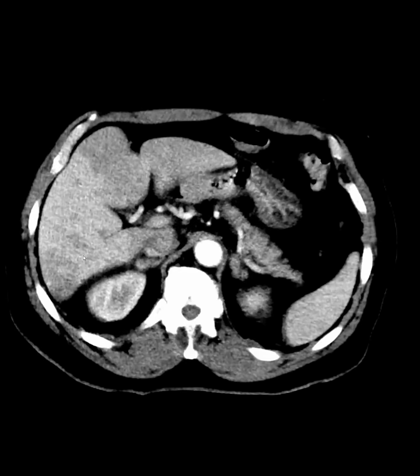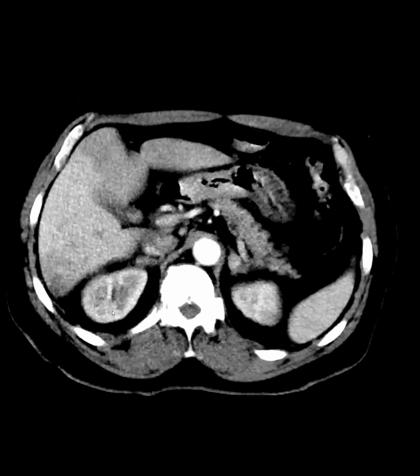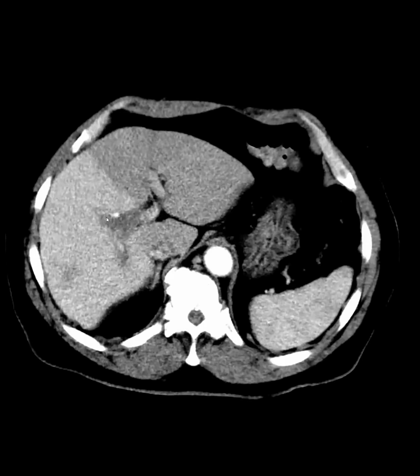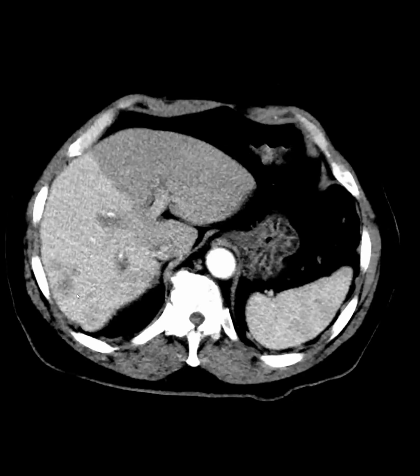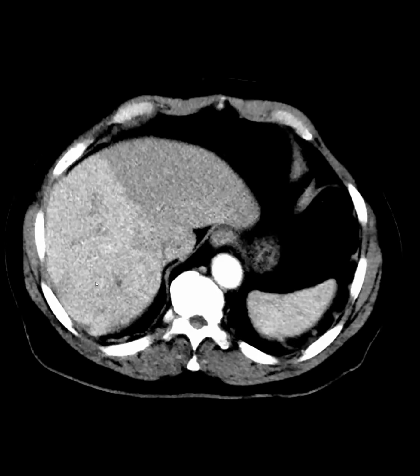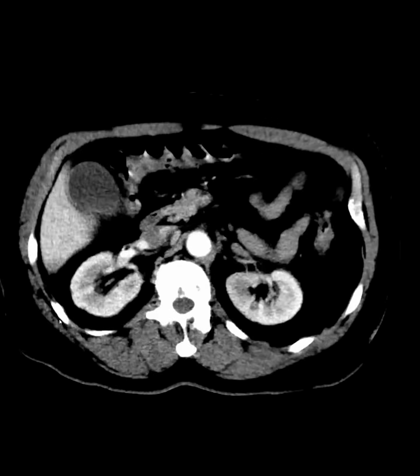Any differential for this stuff in the liver? Well, you get the perfusional change that you've shown us before. Right. Do you have the corona by any chance? We've got a portal vein thrombus, and we've got a geographic perfusional change, and then we have scattered, ill-defined hypodensities in the right lobe.